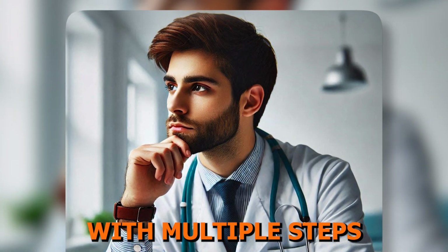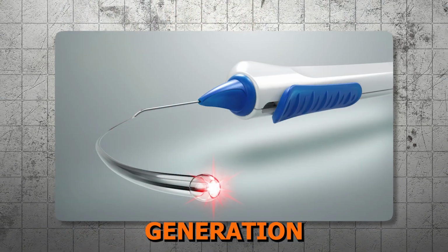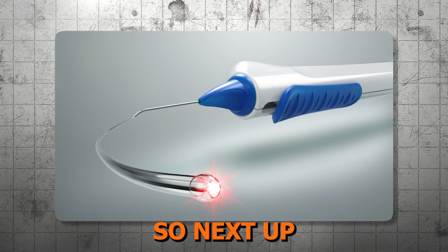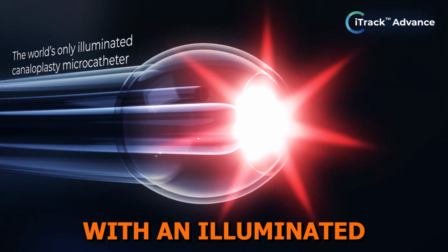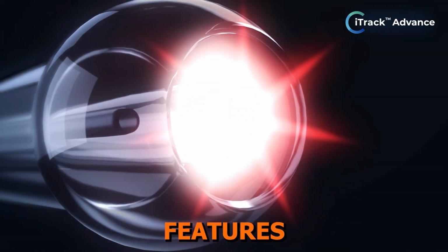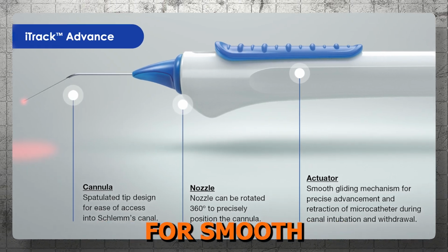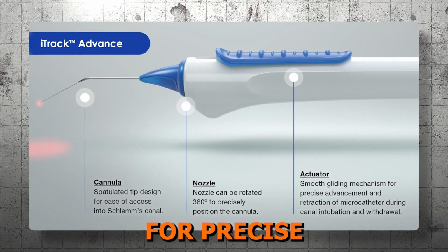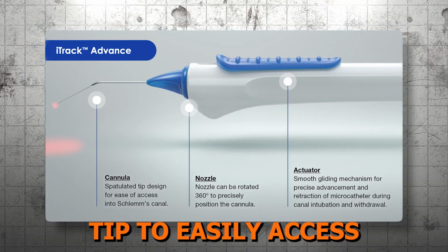Due to some challenges with multiple steps for successful insertion with the first generation iTrack, the second generation iTrack was developed for enhanced efficiency and surgical experience. So next up, we have the iTrack Advance. Similar to the original, it has a flexible catheter with an illuminated fiber optic tip that provides canaloplasty in Schlemm's canal. But what is different is that it features a new handheld injector for easier use. It has an actuator for smooth gliding of the catheter in advancement or retraction, a nozzle that can be rotated for precise positioning of the cannula, and the spatulated cannula tip to easily access Schlemm's canal.